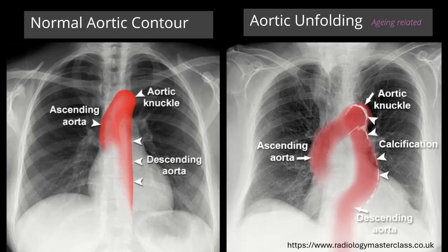We can see these two images, a normal contour in a younger person on the left, the patient we just saw on the right with an elongated aorta, making it more tortuous and curvy. This will significantly increase the calcification deposition. This case is included so that you're aware of some other, yet normal causes for mediastinal widening.